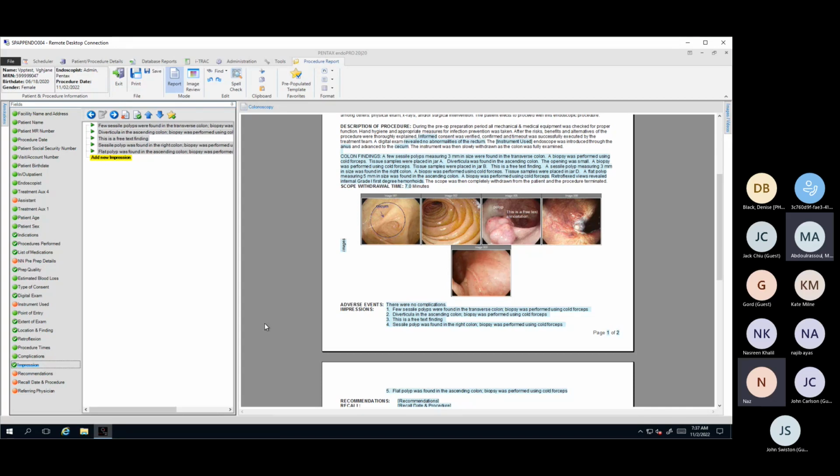Any questions on that? So Munir, I think actually this might work as the annotated part. So the impressions is a very summarized version of your findings. Okay, good. Thank you. You're very welcome.